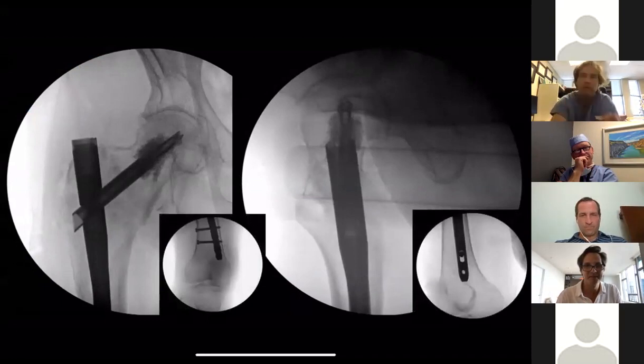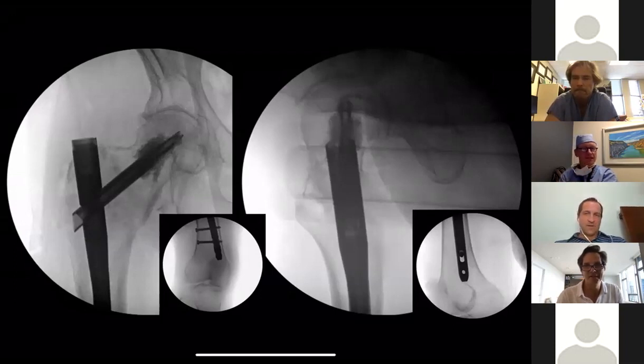And then I left the room and I said, just put in distal interlocks. Crazy. Now, what do you think? Oh, that rotation is heartbreaking. Well, yeah, and it's interesting. If you had used a short nail, you would never even have had it. No idea. You would have known it was that way. Yeah. No idea, right?